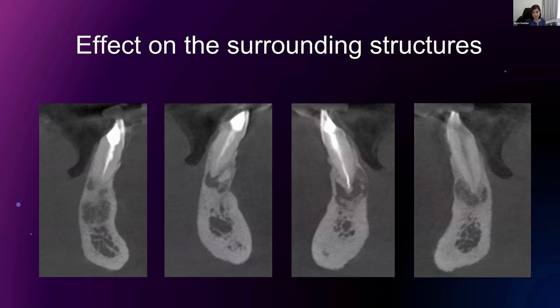They have characteristic features that would confirm the diagnosis, because biopsying these lesions may increase the risk of their infection. So there's no need to biopsy cemento-osseous dysplasia lesions. And we usually recommend follow-up, especially in the cases where there's interruption of the cortices, just to ascertain stability and make sure that there's no infection involved.